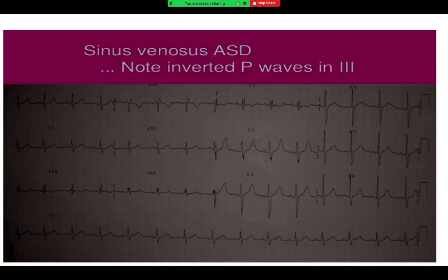How about this ECG? This is a real life scenario ECG, for which I already gave you an example. What I had said is, look for the crochetage sign in the inferior leads. Over here you see it in the 2, 3, AVF already. The lead V1 is also R' pattern, and so this is a typical sign which should make you alert, especially for the sinus venosus.